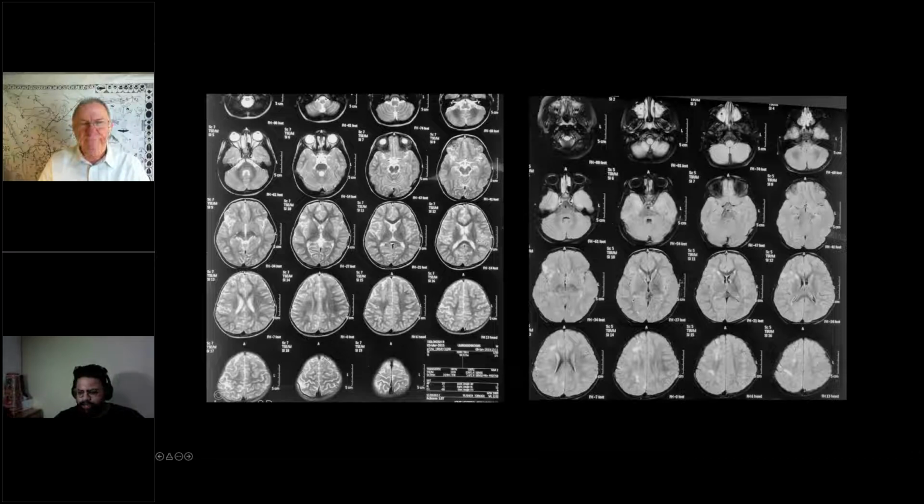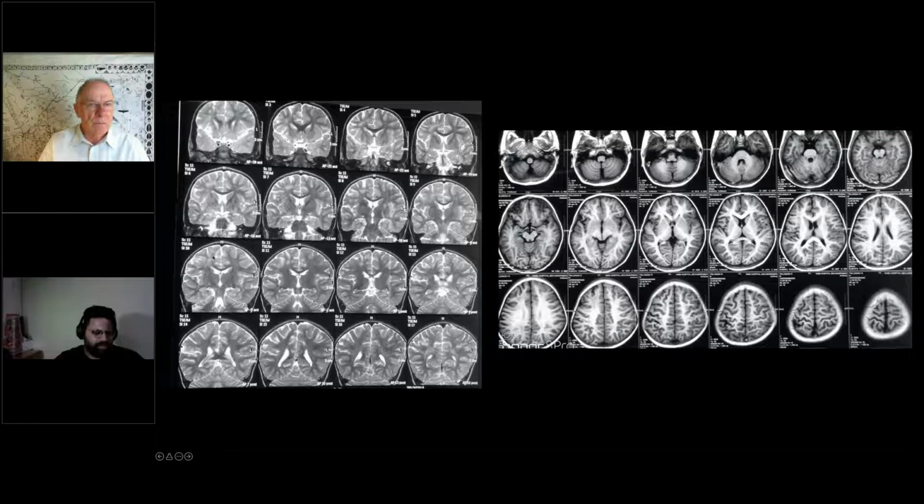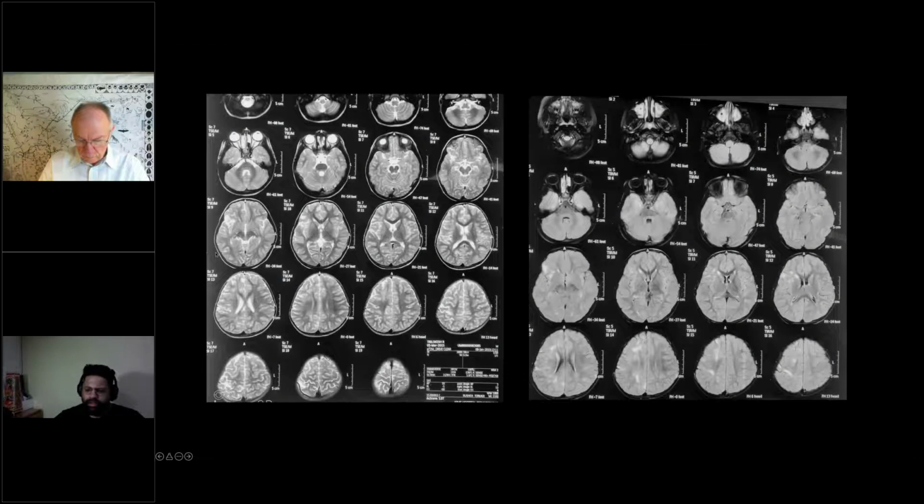The basal ganglia and thalami also did not demonstrate any significant abnormalities. Coronal images show similar changes as on the axials: predominant involvement of the right cerebral white matter and also the gray matter involving the cortex, with some asymmetrical atrophy of the frontal regions.